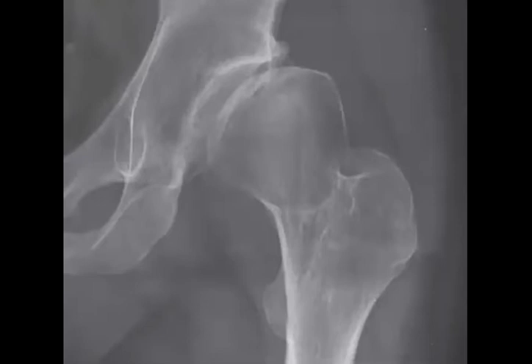Yeah, I agree with you, Justiana. If this patient is an adult, you will put maybe one of the good differentials, femoral acetabular impingement. Yes. What do you think if he is in the pediatric age group? Yes, Marwa, perfect. So maybe this patient has what is called developmental dysplasia of the hip. And you can imagine the size of the acetabulum.